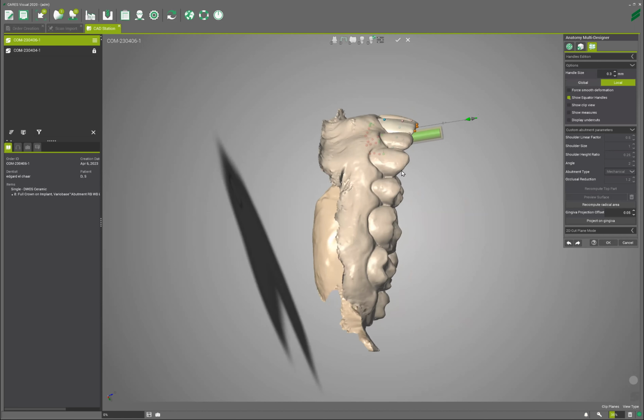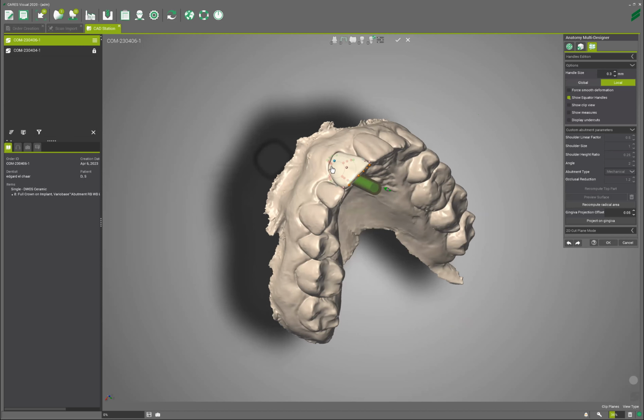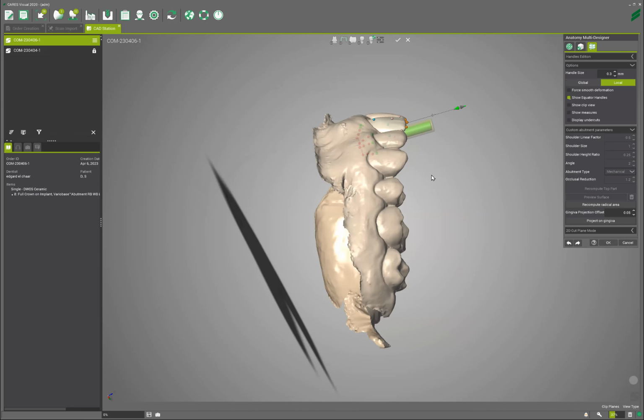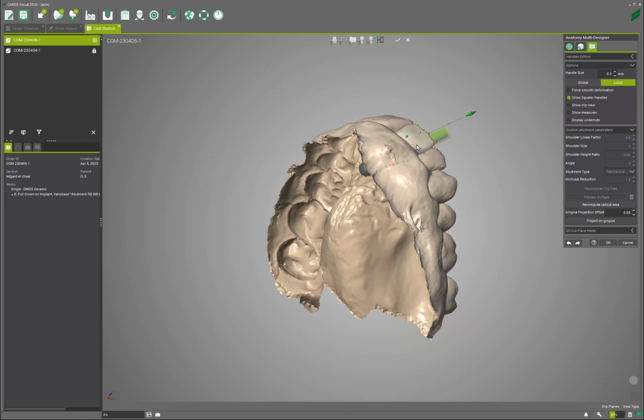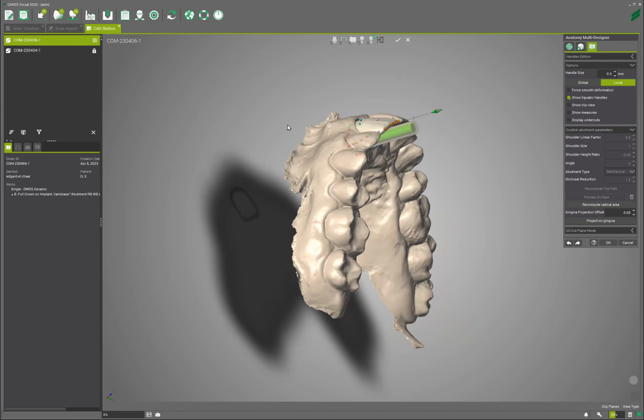There you go. All right. If I can add a new point here, voila. That's it.